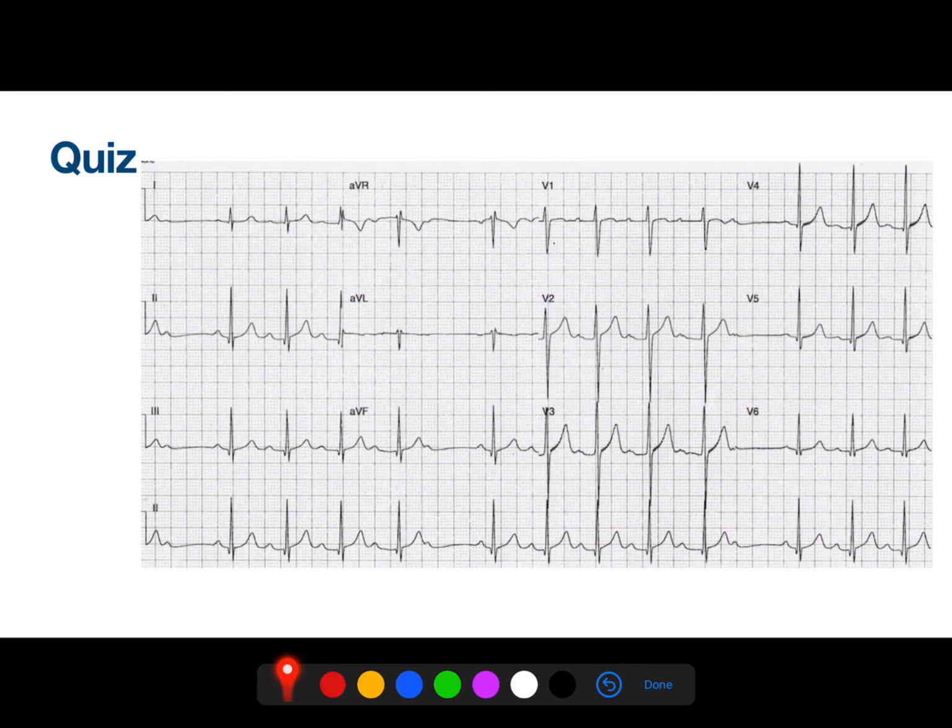So the next case. I will give you some time to pause the video and then we can see. Here we see again the QRS waves, so we see that there's activity. But it looks a little bit weird, because there's not a regular rhythm. These are regular, and then there's a break. So we know that there's something wrong.